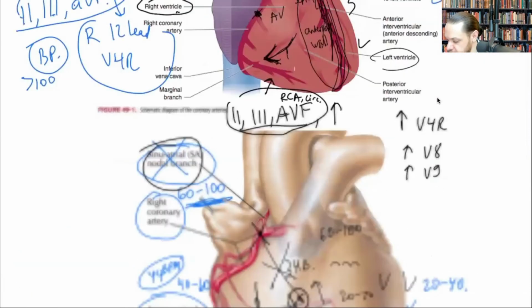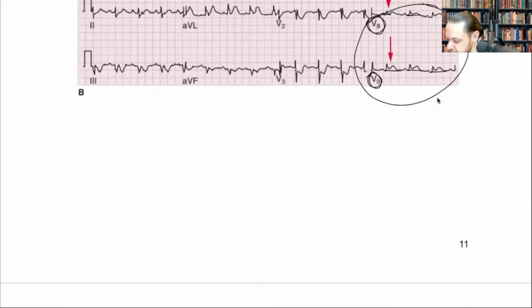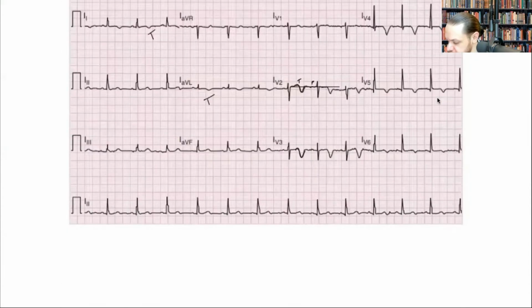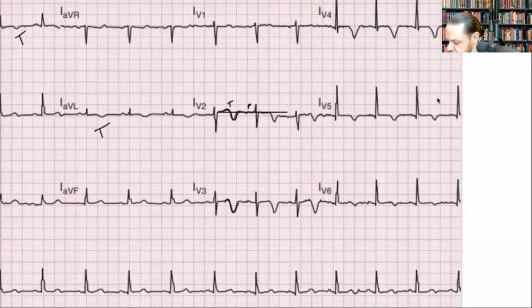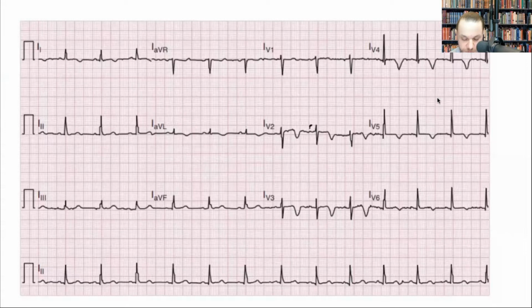So this is actually called the Wellens. This is not ST segment elevation in here, right? So it's this particular. Let me erase all this so you guys can see it, right? So this is the Wellens. So they say this interpretation here is Wellens is the syndrome found with abnormal T waves that is seen here in precordial leads V2, V3.